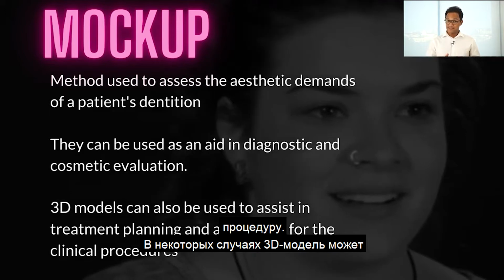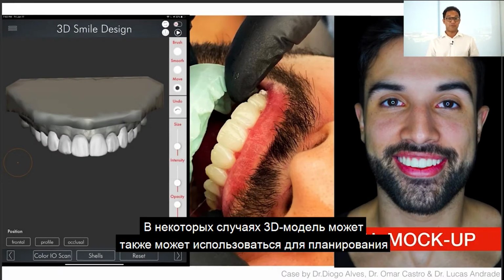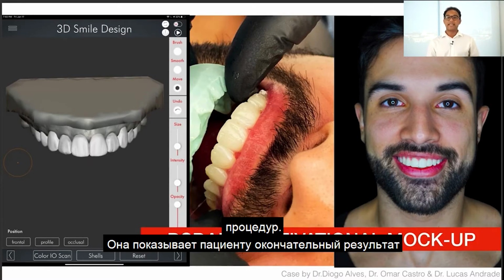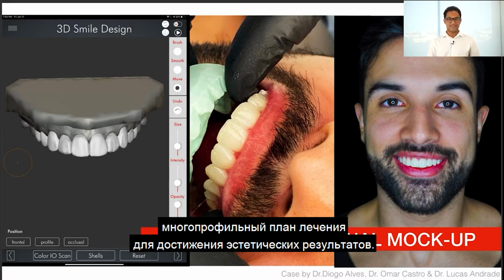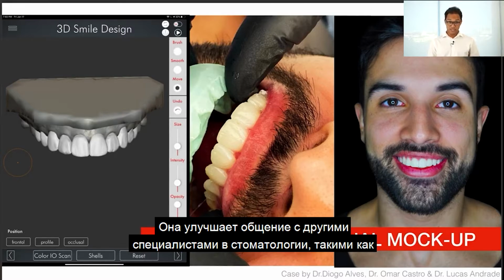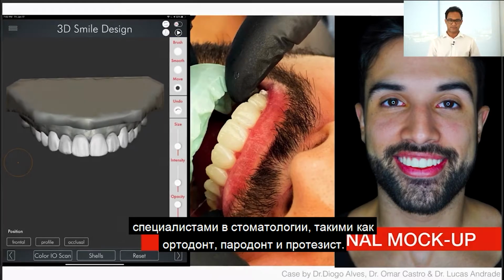In certain cases, the 3D model can also be used to assist in treatment planning and used as a guide for clinical procedures. It shows the patient the final outcome of the treatment while supporting the need to go through a multidisciplinary treatment plan to reach the aesthetic results. This improves communication with other specialties in dentistry, such as orthodontists, periodontists, and prosthodontists.